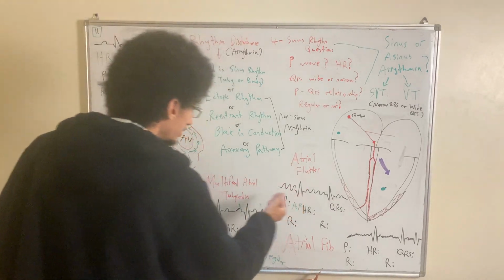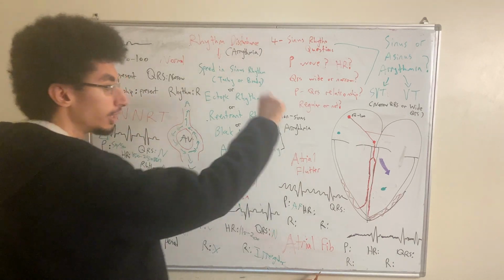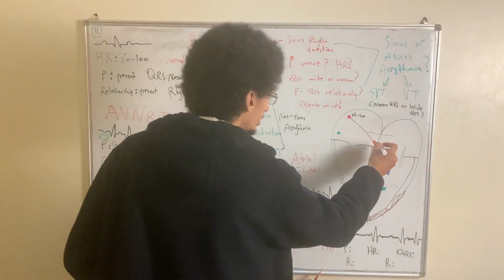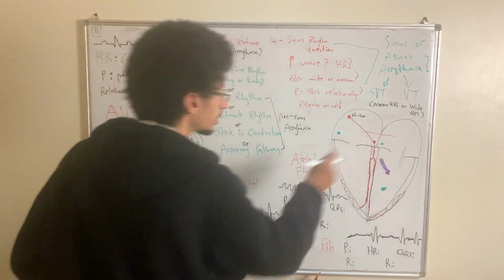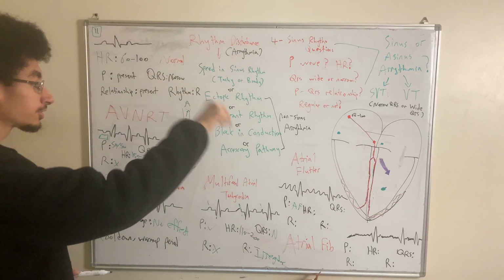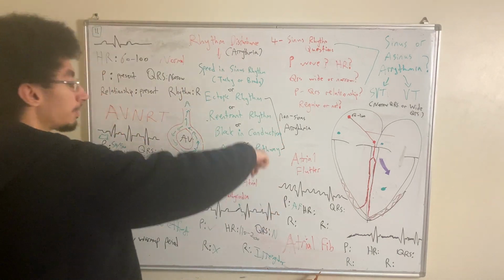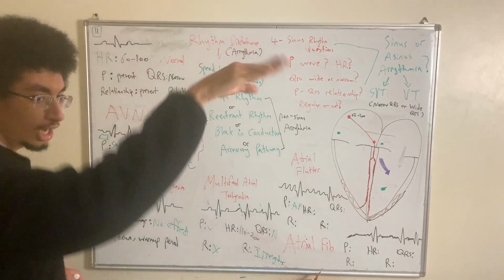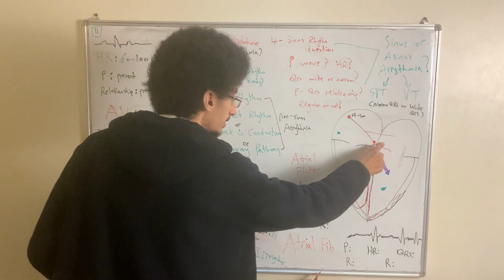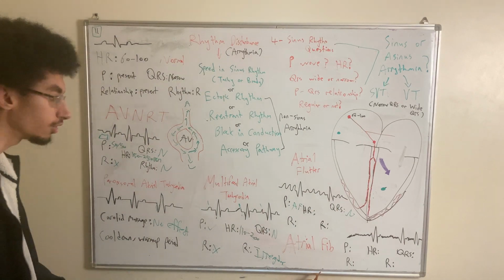So, in a case of atrial flutter, when we ask about the P wave, it may show a flutter wave. And why does atrial flutter occur? Because, again, we'll have an ectopic atrial foci near the tricuspid valve or near the mitral valve, where it's sending its own signals, and it's sending a lot of them, which will give us the appearance of a P wave. There is fluttering, going up and down, giving us a sawtooth appearance. However, the QRS is normal, it's narrow.